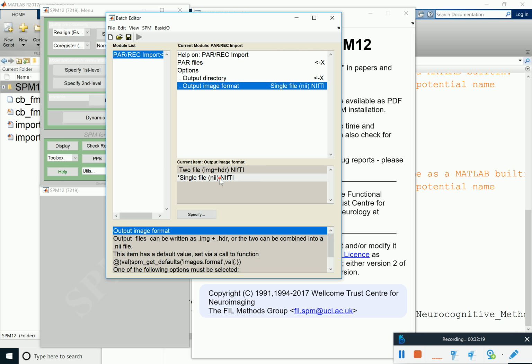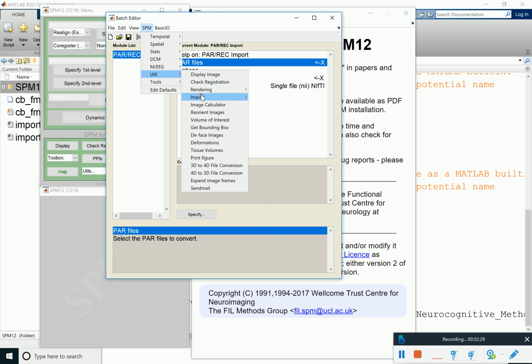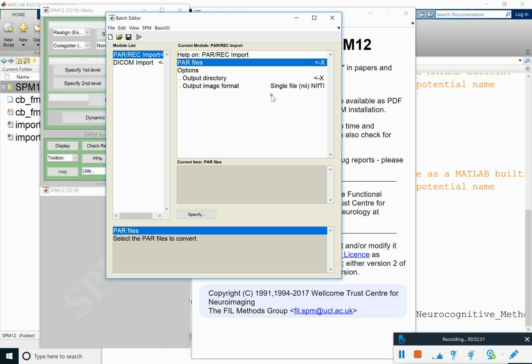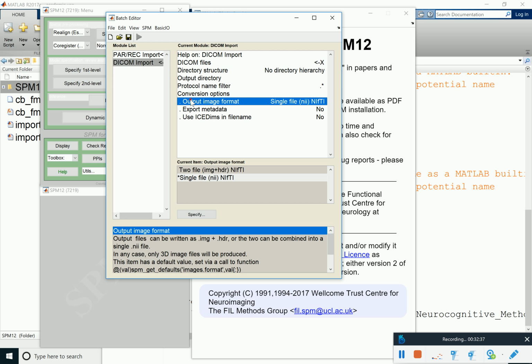Yeah. Can do. Let's see whether that's maybe for DICOM, because maybe that's the only option for DICOM. Oh, but here you can also use a single Nifty file. You don't have to do header image. So it's better to do the same. Yes, then your results are right and you know how the brain works.